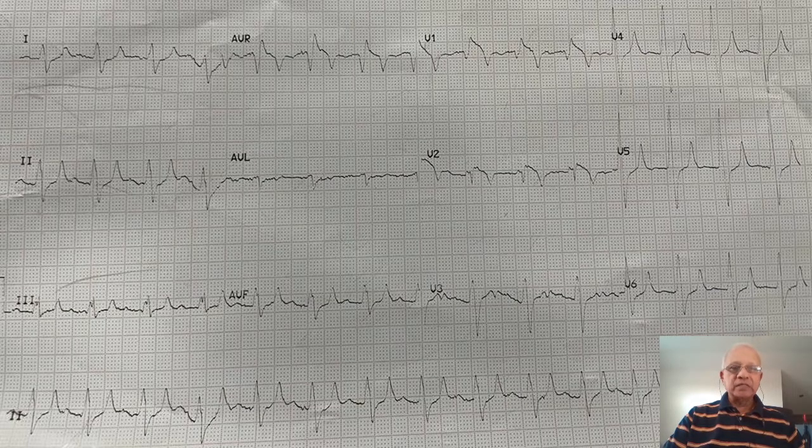Now this is the ECG of a 25-year-old female, which was sent to one of my consultants, Dr. Priya from the Department of Nephrology in the Baby Memorial Hospital. This patient had come to the hospital for a routine checkup. ECG was taken as she was complaining of dyspnea and some palpitations and also some muscle weakness.